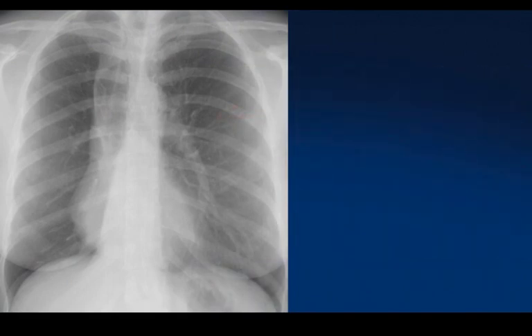This is somewhat of a confusing radiograph at first glance. There seems to be a retrocardiac opacity, but there is also an opacity along the upper mediastinum, and it's tempting to look at this case and think the patient perhaps has right lower lobe atelectasis and perhaps right upper lobe atelectasis as well. In fact, this represents the anterior mediastinal fat.